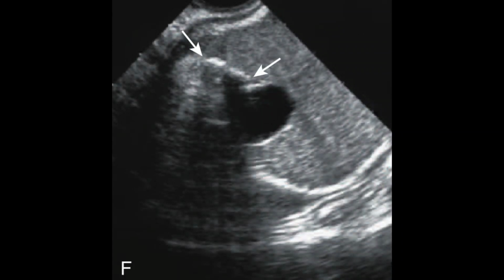Another characteristic radiological pattern for the dermoid cyst or cystic teratoma: on this slide, this is a transvaginal scan, and you will appreciate three important features. The one is homogeneous echoes within the lesion. The second thing, indicated by the white arrow, is calcifications.